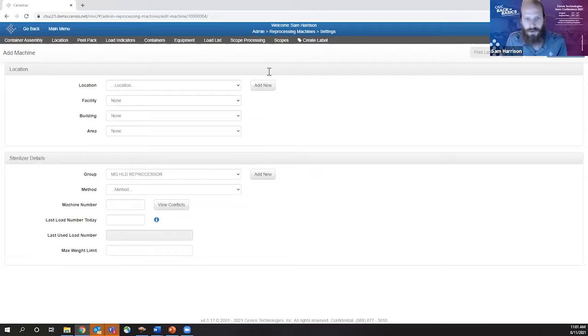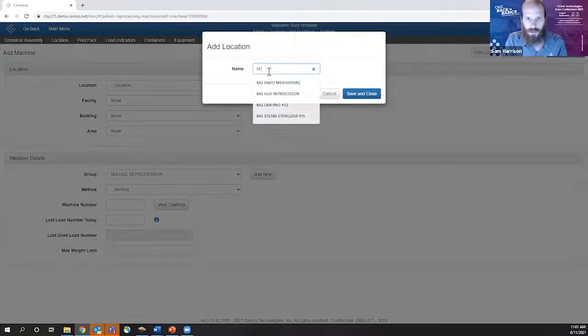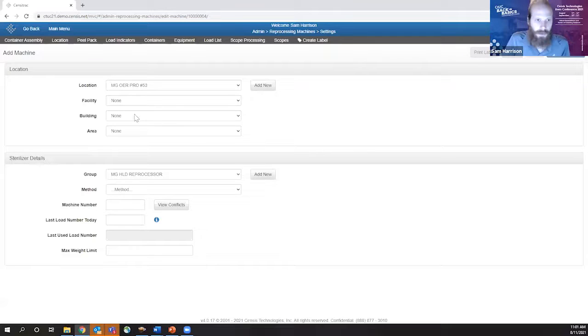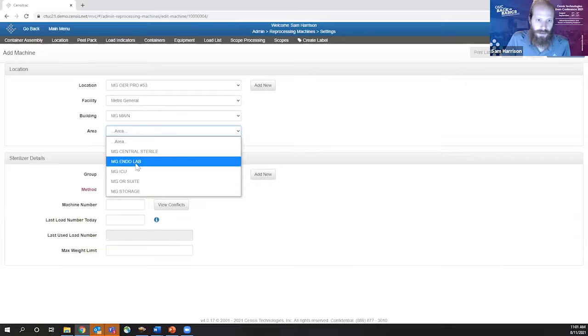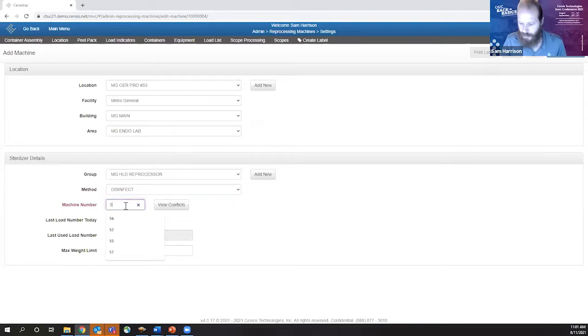I'm going to click add new. I'm going to call it MGOER Pro number 53. Then I'm going to go to facility. I'm going to put it in the facility area. I'm going to put in the endo lab. The method I'm going to choose is disinfect. The machine number is 53.